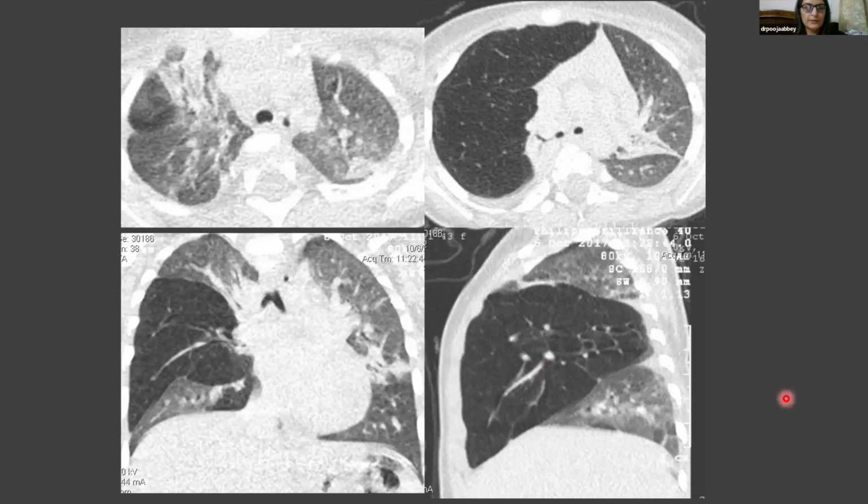So at the first look, what do we see? We see that on the CT, these are the lung window sections, axial, coronal, one sagittal section. So our preliminary suspicion is confirmed that yes, there is hyperinflation of a part of the right lung, right? And then we have to define what is the area which is involved. So on the sagittal, we can see that this seems to be the major fissure or the oblique fissure, and this is the horizontal fissure.